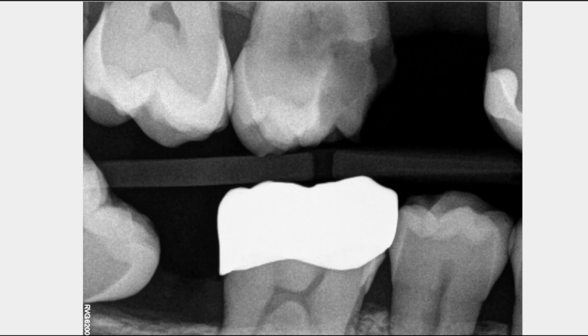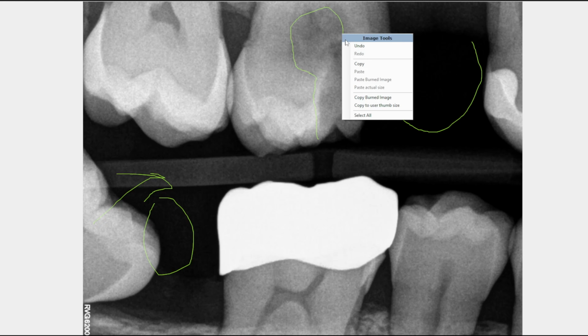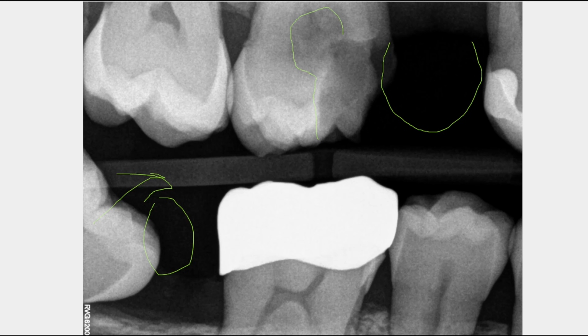We're missing tooth number four. We have this gap here. There we go. We're missing tooth number 31. 32 has dropped in sideways. Number two actually looks pretty solid. This obviously doesn't show the perio defect we saw on the cone beam, but two actually looks really good. And then you can see the extent of the decay going down like we talked about, getting deep inside there. So we talked with him about it, and here's what we came up with as the plan.